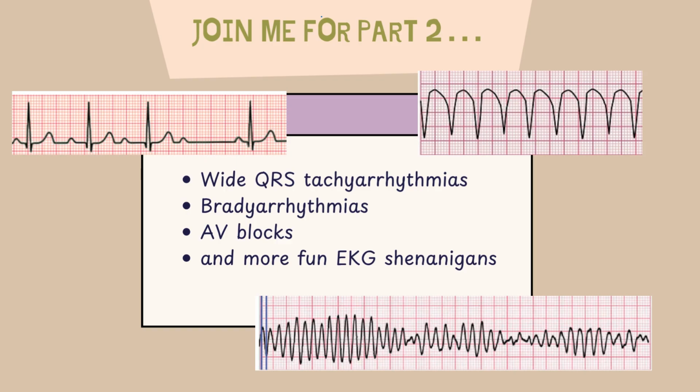All right, guys, with this sheer excitement about MAT is where we're going to pause for now. We just walked through the most common and most chaotic of the narrow complex rhythms, from sinus tachycardia doing its job to atrial fibrillation doing whatever the hell it wants, and even MAT throwing its own chaotic party. In part 2, we're going to head into more dangerous territory. We're going to cover wide complex tachyarrhythmias like VTAC and Torsades. We're going to follow it by bradyarrhythmias and AV blocks. So take a breath, grab a snack, grab some coffee, and I'll meet you in the next one where we learn what to do when the ventricles take over.